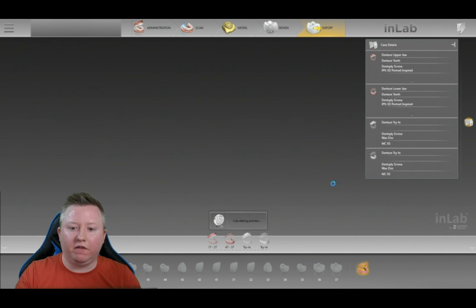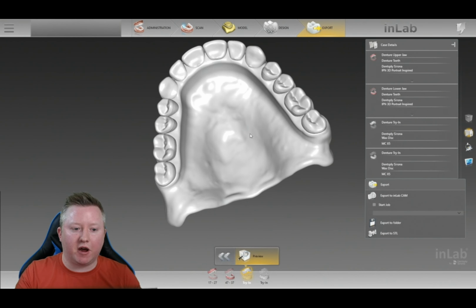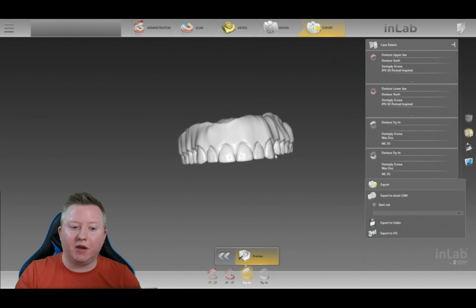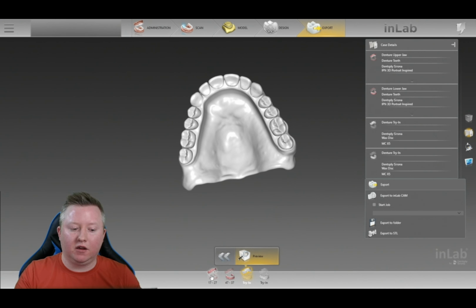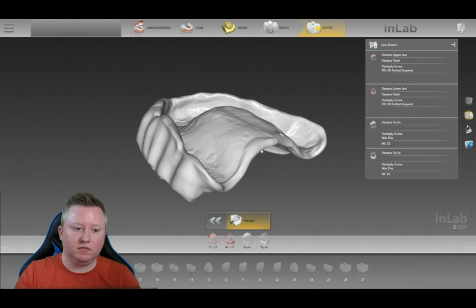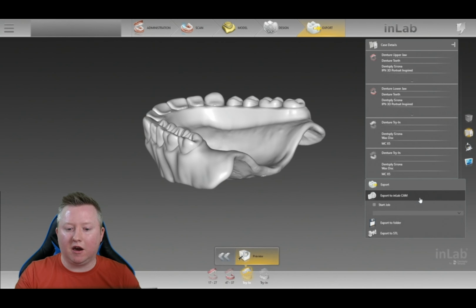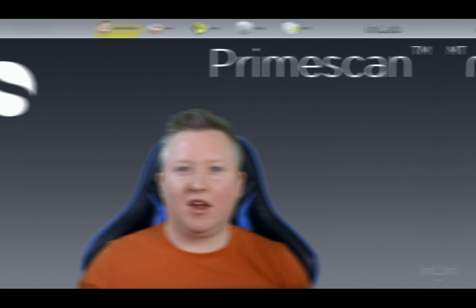So we're going to calculate all our previews again, but now we're going to have our digital denture monolithic try-in to be able to print with whatever corresponding printer try-in material that you wanted to use, with the corresponding 3D IPN teeth printed. So this is going to be an exact representation of what this upper denture base is going to be with the 3D IPN teeth already placed. So there you go. And both of them you can export as an STL or to CAM, whichever material you wanted to use. So that about sums it up.